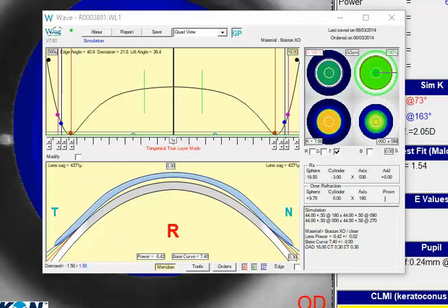In this case, you have a relatively well-fit scleral lens, and you're hoping to increase the central vault, hopefully without changing too much the rest of the fit. So a couple of values to look at.